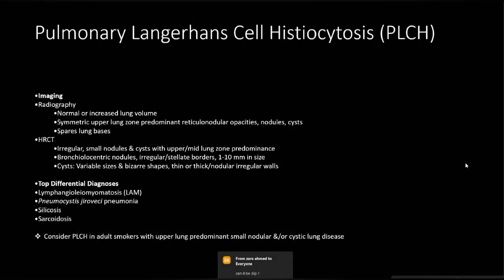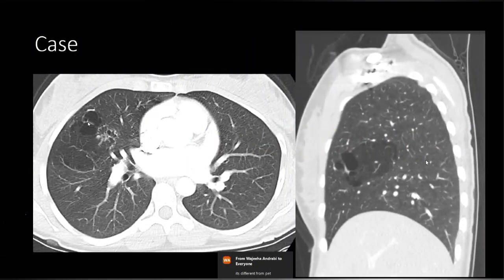Whenever there is a history of smoking, with these centrilobular nodules which are mid to upper lobe predominant, there's a spectrum of respiratory bronchiolitis. Respiratory bronchiolitis ILD is not a disease entity in itself. Try to consider it. There's an area of lucency over here, right? Yes. And there are some lobulated lucencies over here as well. Surrounding this area, there are generalized areas of differential lucency. If you look at the sagittal reformat, there are cyst-like and cystic areas with surrounding areas of air trapping.